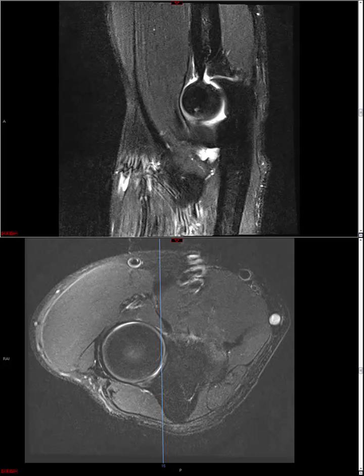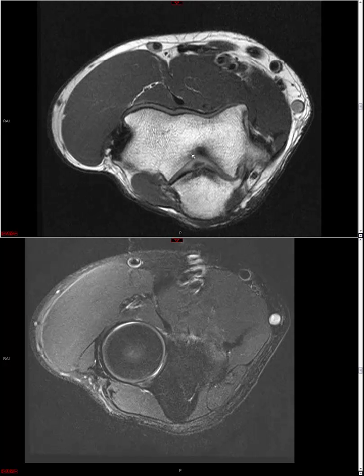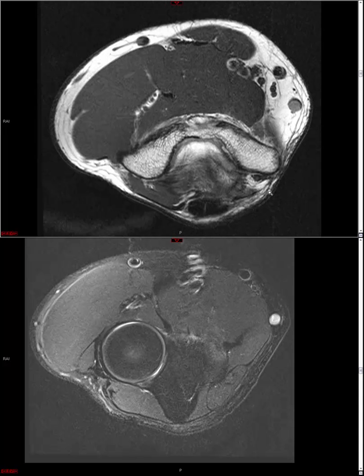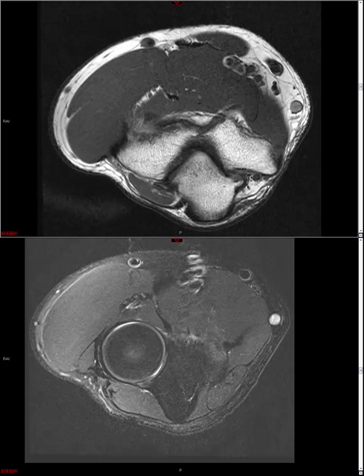So let's see, identification of nerves of course is greatly facilitated by identifying and following perineural fats. So I think a lot of the analysis can be done on your axial T1 plane sequence, right? And let's start with something easy like the ulnar nerve. So an easy place to find the ulnar nerve, of course, is at the cubital tunnel. So here is the medial epicondyle. This is the Osborne ligament, so this is the roof of the cubital tunnel.